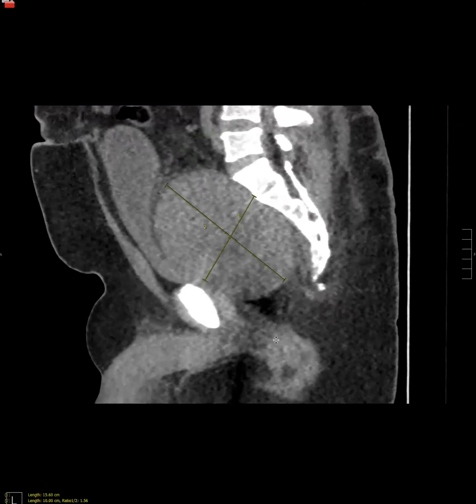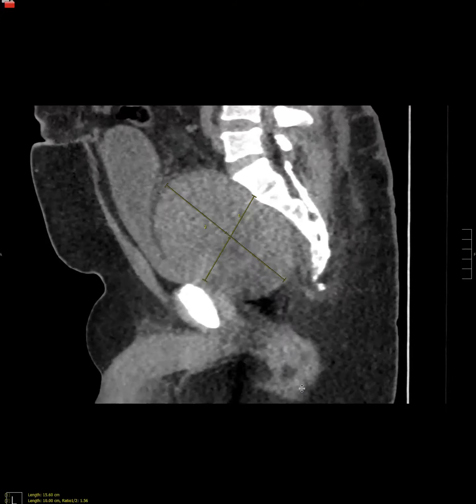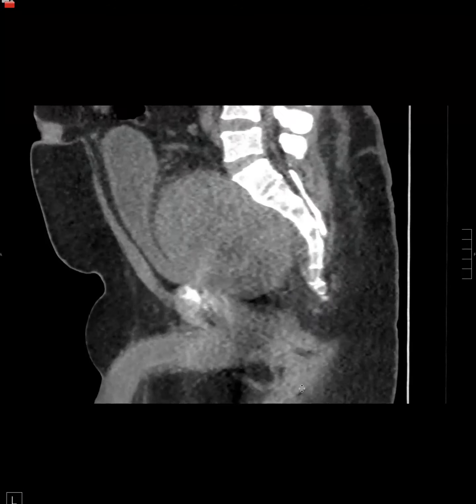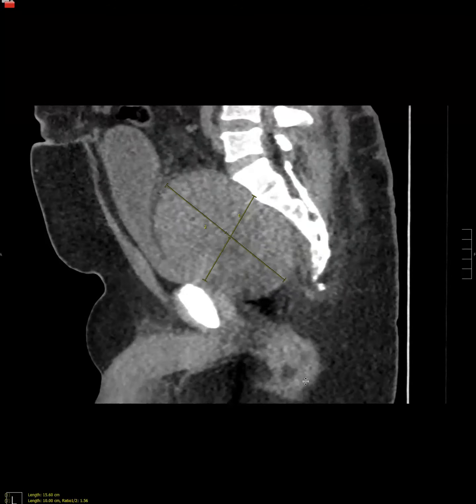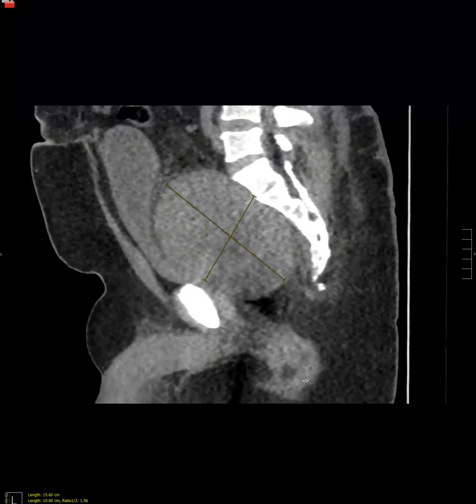Excellent. Yes, that's right. So we all make mistakes. This was read by outside as a prostate mass. We only have these images in retrospect. And so the patient went for a HoLEP.